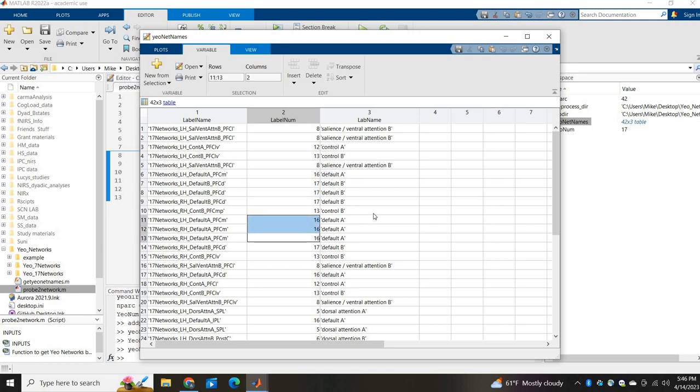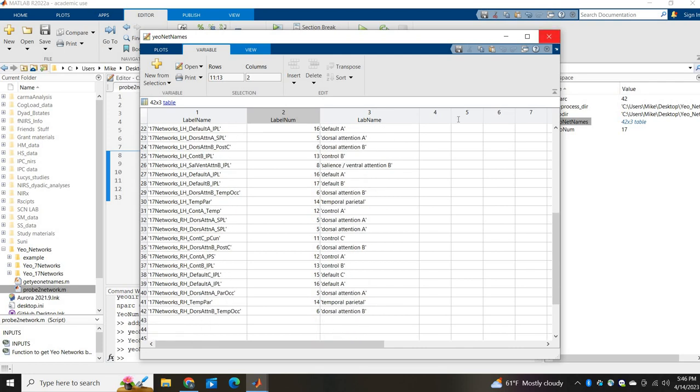So it really depends on like what you're doing. I like this because we don't get subcortical, so we don't get every network. So we're not going to get the limbic network. I don't measure occipital, so I don't have the visual network. So I like this because it gives me a little bit more nuance. But again, it just really depends on like what you're doing, and it's up to you. But yeah. All right, and that's it.